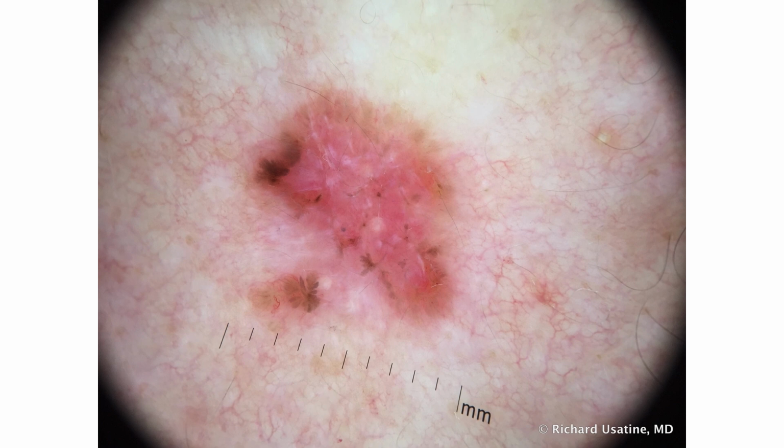Here's a really nice looking leaf, almost like a spoke wheel. And of course, it's the same structure. They can be described as well. We can talk about them looking like leaves or spoke wheels.